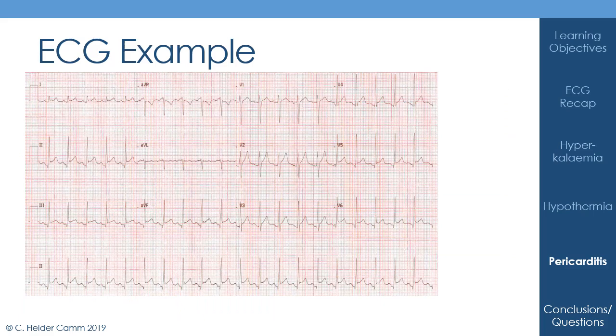So here's an ECG example. Feel free to take some time to go through it, and pause the lecture and then we'll go through it together. Okay, hopefully you've had a chance to go through it now. So let's start at the top. So the details are that this patient's got some chest pain.